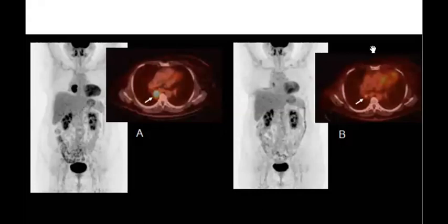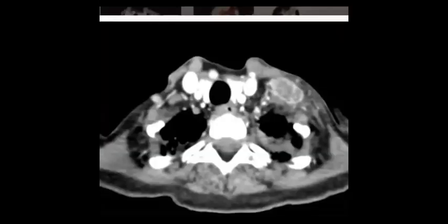And you can see, until we collect the findings, and finally we, or hopefully we, can reach a diagnosis. So what do you see here, abnormal? Can you analyze it?